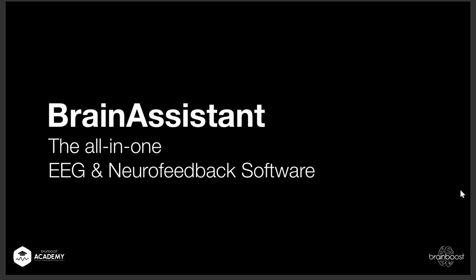In this webinar, we show you how you can use our auto report as a template. You can then add certain features such as text, an image or a screenshot of an EEG. Also, we show you how you can customize the report, such as the footer, the header, and also implement your own logo in the report. Have fun using it.